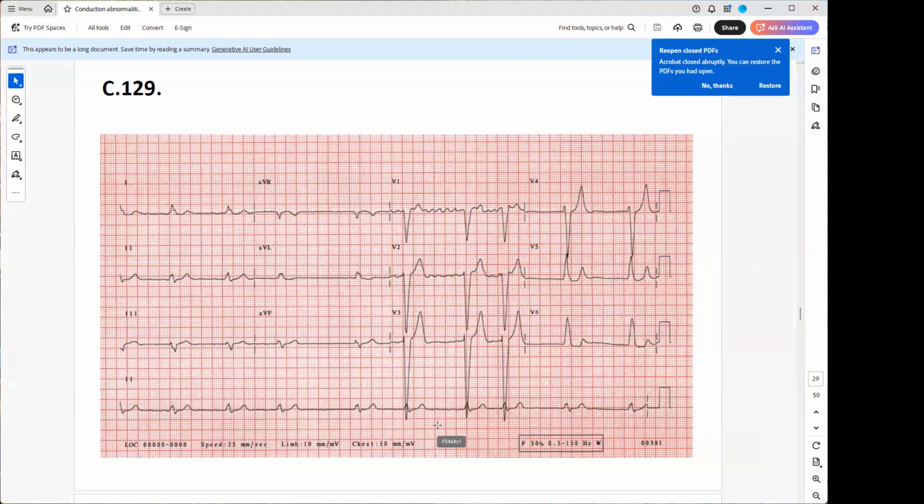And then also, from first glance, there is the widened QRS complex, and also the S wave is slurred in V5. The ST segment is altered, but this is a wide R wave in V5, V6. So that's a secondary intraventricular ST change. So intraventricular conduction abnormality.